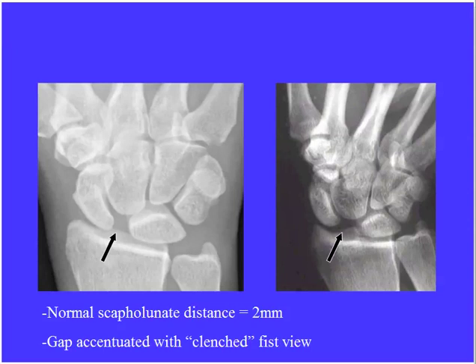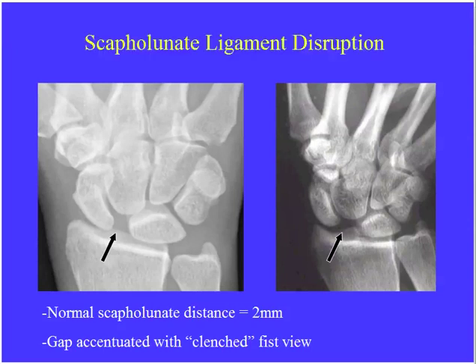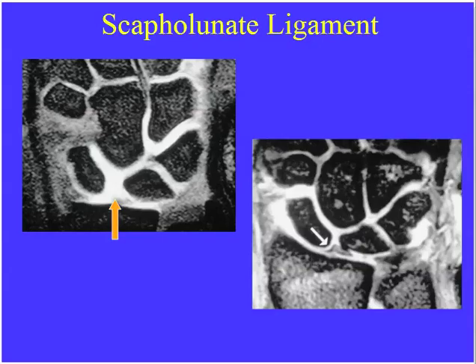They may also show you the MR appearance. With MR, there's typically a watertight ligament coming across the scapholunate ligament. If we see either contrast or fluid on a T2 weighted image breaching or perforating that scapholunate ligament, that represents a tear of the scapholunate ligament. Potentially, they could show you the lunotriquetral ligament, but it's unlikely they would show that. If they're going to show one of these ligaments, it's going to be the scapholunate ligament or the triangular fibrocartilage.